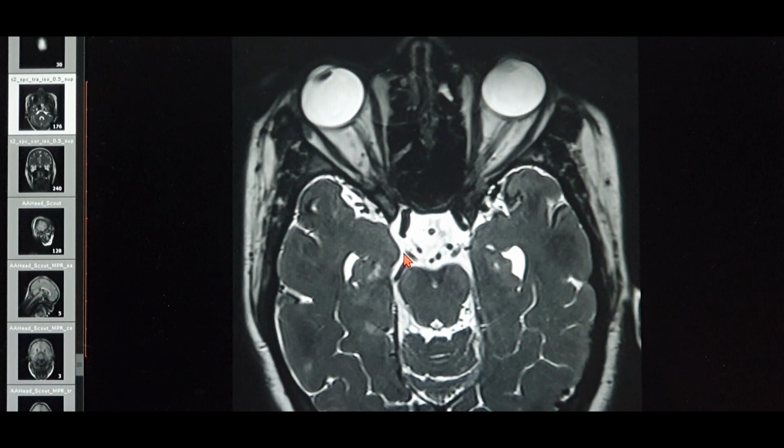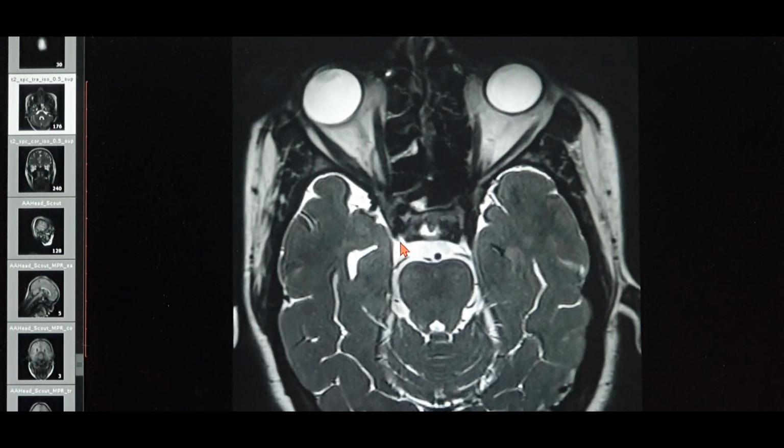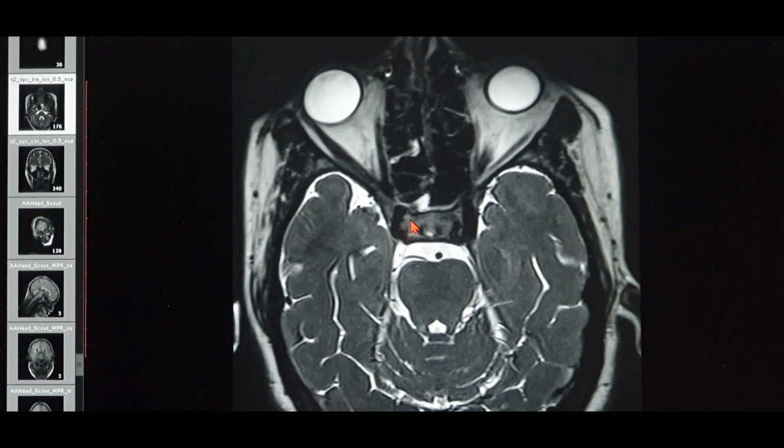Now that's the posterior cerebral artery coming into the picture, and the posterior cerebral artery, through the help of the posterior communicating artery, as you can see over here, goes and joins with the internal carotid artery, which you can start seeing over here. Now this is the area of the orbital apex, and this is the lowermost aspect of the sphenoid sinus over here. So you're coming from below to above, so that's the internal carotid artery, almost at the level of the inferior aspect of the sphenoid sinus. That's the orbital apex, you can see.